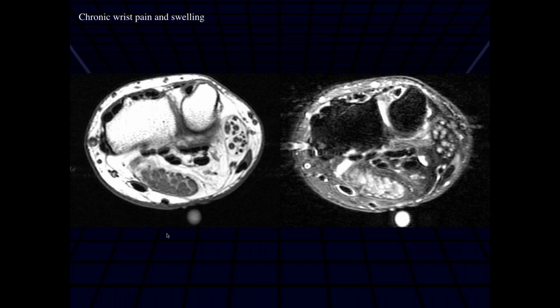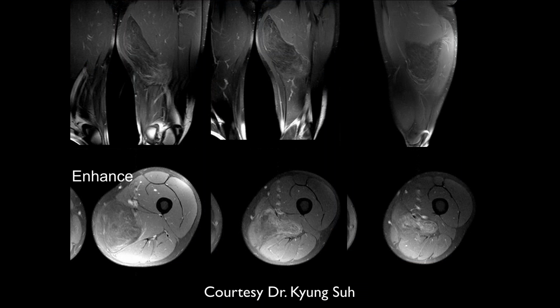So even in this lesion, you would not take out a margin? Well, you cannot say that it's clearly benign. You don't want to stick your neck out. What you want to say is cannot rule out malignant change or whatever. Yeah, I think any wording along that line. And I talked to the physician, and they may have their own suspicions and would like a certain kind of wording. You can't say this is clearly a benign lesion, though more than 90% of lesions that look like this will be benign, but not 100%. It's a suspicious lesion.